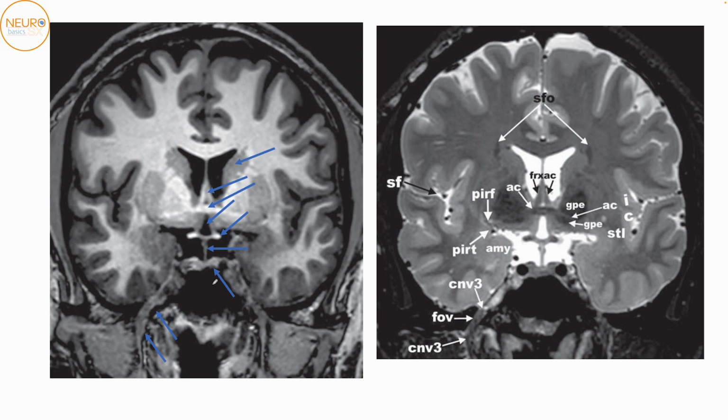Right. So as we go more and more posteriorly, there are a few structures that we can see further. This is still the cavernous sinus over here. Okay, so again, here is the cavernous sinus. We can see there's a structure coming out of the cavernous sinus and running inferiorly, and there's a hole in the bone. This T1 hypointense and T2 hypointense region on both sides of the bone.